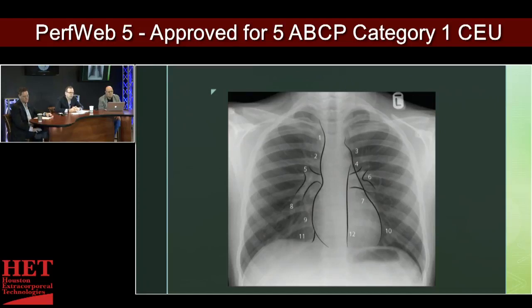Number 8, moving down towards the subsegmental pulmonary arteries and pulmonary veins. 9 would be the right lateral border of the heart. 10 is just kind of into the lung fields where you see the lung parenchyma. And then 11 is down by the inferior vena cava as well as the diaphragm. And then 12 is somewhat down towards the reflection of the pericardium onto the diaphragm and then into this gastric region, which is just below it.